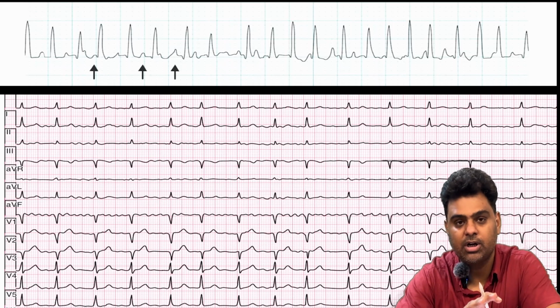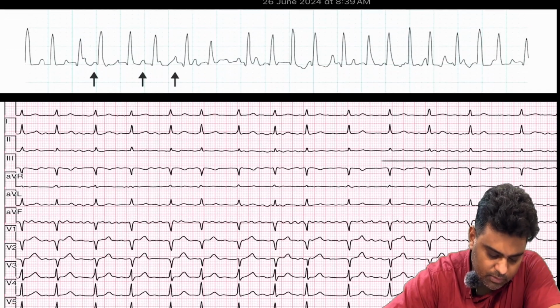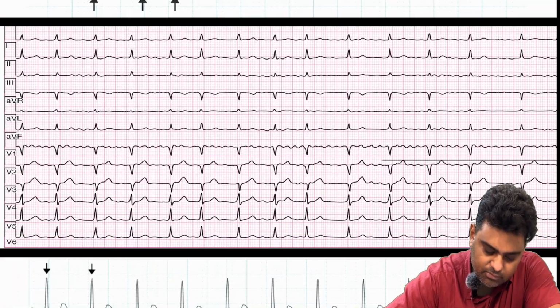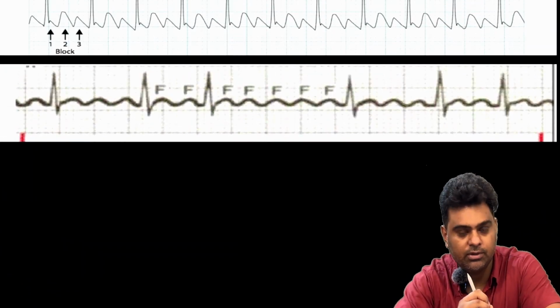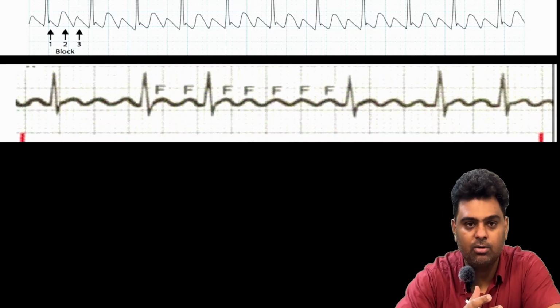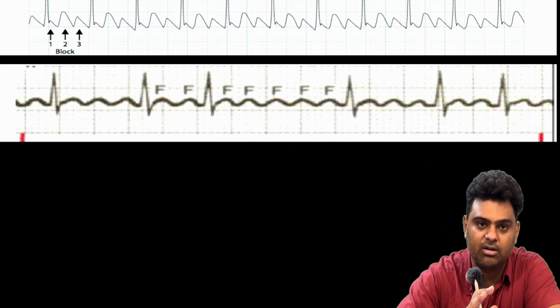So today we will be starting with atrial fibrillation. Now we have 4 ECGs in front. We all know that if on ECG we see an irregular ventricular rate or irregular rhythm, we say that it is atrial fibrillation.